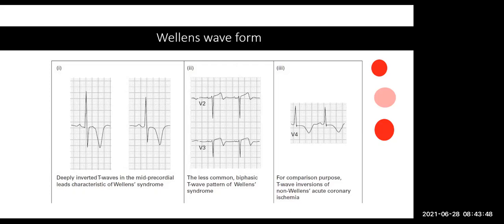The worst thing you can do for these patients is wait for enzymes, wait for the physician to come out, wait for them to say they want to thrombolyse, do the thrombolytic checklist. They're wasting time. The patient's going back to what they were before. You need to be able to, in 2 years' time, remember, Dr. Mohammed said something about these inverted T waves. It's not right. Quickly Google inverted T waves pain-free patient. Wellens just pops up on Google and Bing, because I checked on both.